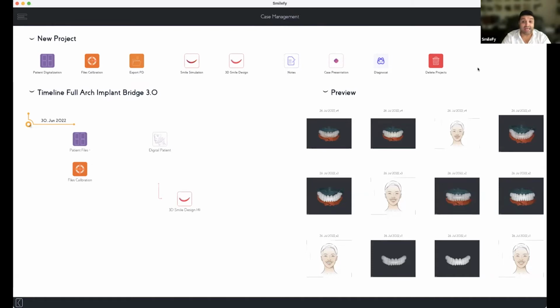Of course. If you can set any reference when you scan, or if you take the picture and you can set any reference for the midline, for the gingiva, whatever it is, you can do it, and then it's easier because you have more references to calibrate. Yes, of course, any creative idea is welcome.